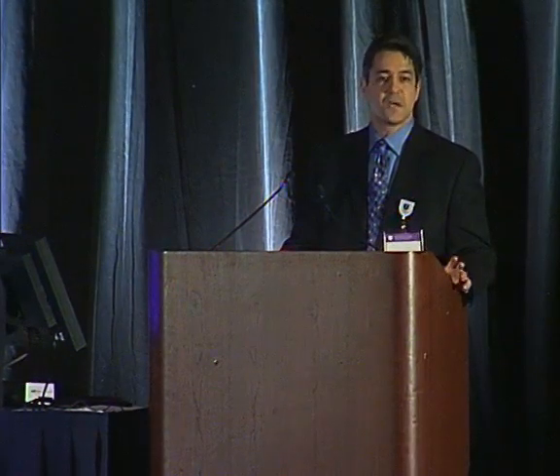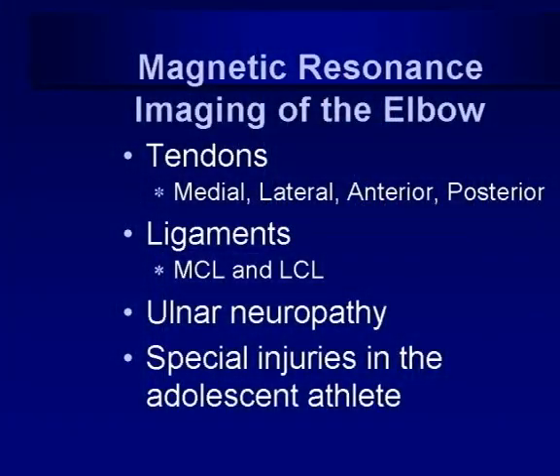So I'm going to begin by discussing the tendons. And when I discuss the tendons, I'm going to compartmentalize things. So I'm going to discuss the medial tendons, moving on to the lateral tendons. Then we'll talk about the main anterior tendon or the biceps tendon. And then we'll talk about the posterior tendons.